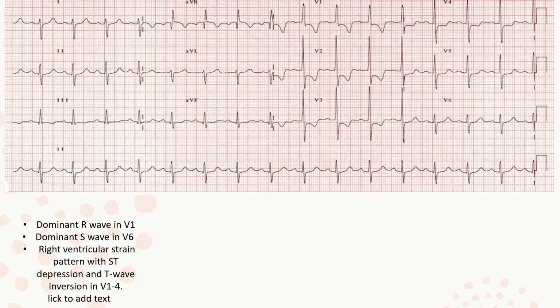Okay, let's step back and look at this whole EKG, because we really do need to follow our normal progression as we start looking at 12-lead EKGs. So let's start off by figuring out, is it regular and what's the rate? Looks pretty regular, 1 P for every QRS. The rate appears to be 300, 150, 100, just a hair below, so in the 90s.